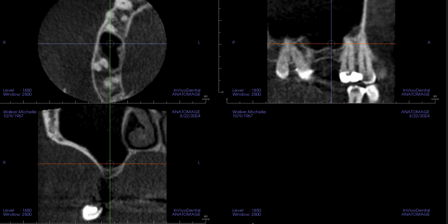Nick, you had shared a case with a patient having some issues. You had said number 2 was recently removed. This is the pre-op CAT scan taken. You most likely were trying to assess whether or not the roots were adjacent to the sinus.